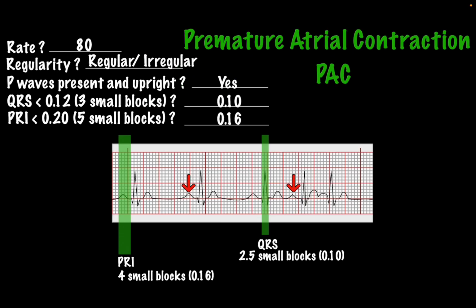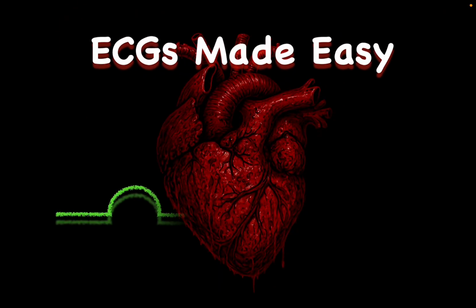So in this rhythm, that's an individual beat, but the same phenomenon can happen and it can actually override the rhythm. And that's it for this episode of ECGs Made Easy.